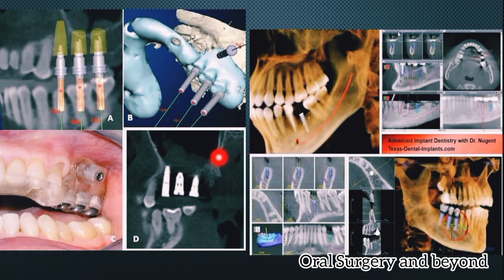The most important application is implant planning, right? As we identify the bone available on the scans, we can do a splint formation. Here the splint is made with the help of CBCT scans. CBCT is done, DICOM data is sent to the dental labs, and with the help of that DICOM data, they have made such a splint. So the dental surgeon just needs to place this splint and place the implant at the desired level.